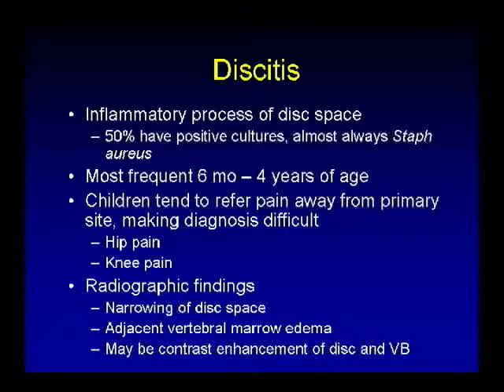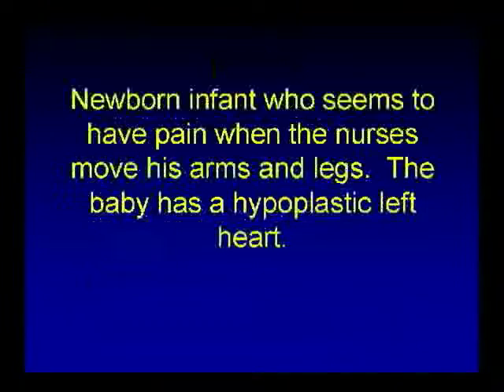And the radiographic findings are, as I showed you here, disc space narrowing, which on the plain film may be rather subtle. At MR, you'll see contrast enhancement of the disc and vertebral body and marrow edema.